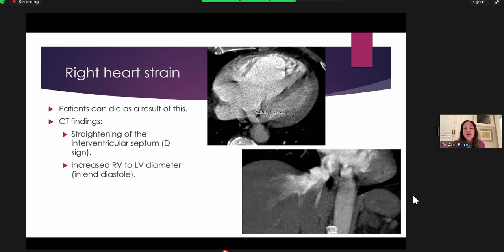So what you do is you line it up on the coronal image and you line it up on the sagittal image so that you're pointing directly through the apex of the right ventricle. And then you go back to your axial image to create a true axial. Because right now, when you look at axial images, it's an axial through the chest, right? But it's not an axial through the heart because our heart isn't perfectly straight in the chest. So when you're cutting the patient into slices on an axial CT, the heart is oriented obliquely. So you can falsely get an increased RV-LV ratio.